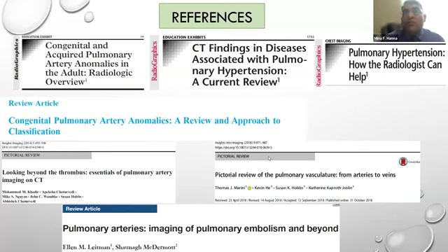Sometimes there is some motion, the maps are not good. So I'm not depending on the map only. I read the study and add value with this map to help me for the small emboli which I can see.